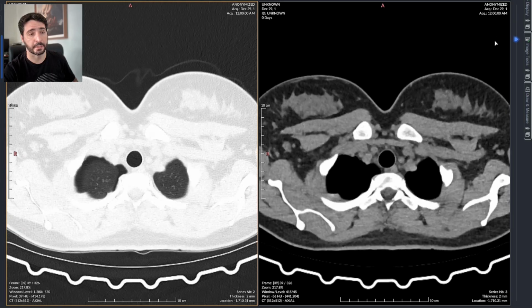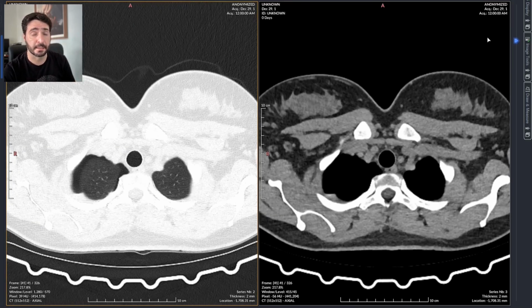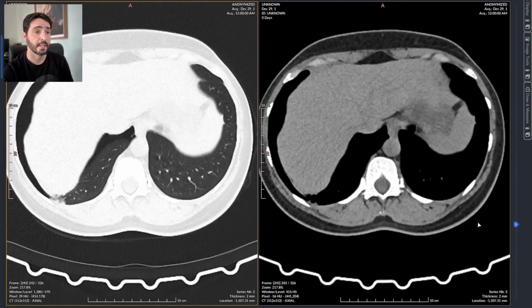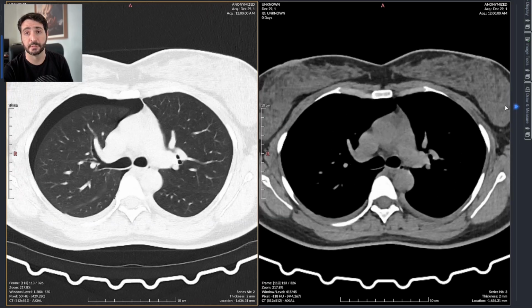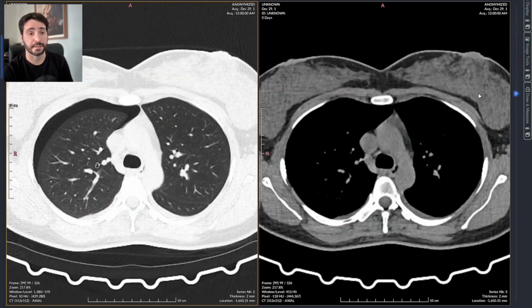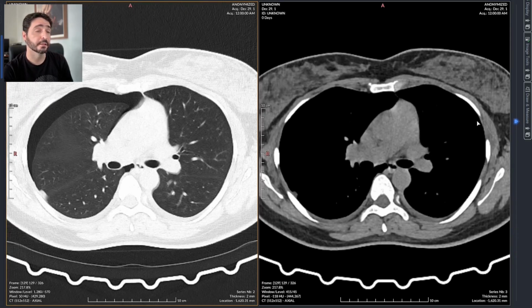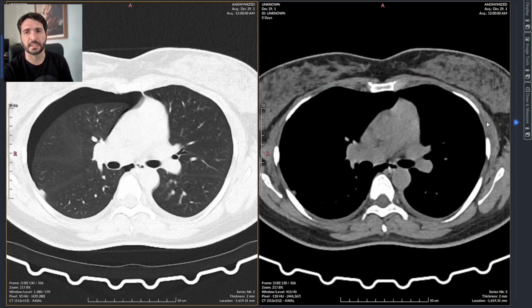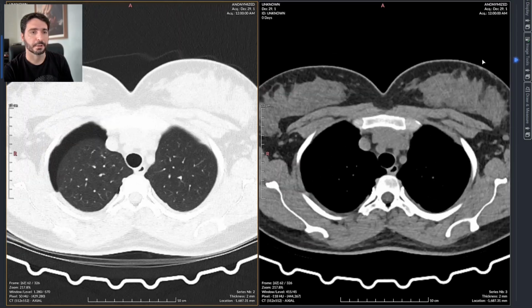I can't really tell where it came from, but I could guess it came from a small blob of air right at the apex of the superior lobe, which is the most common cause of such disease. So, as you know, we have also a bit of fluid, so this makes it a hydropneumothorax, not just a simple pneumothorax, which is quite common because there is pain, there is kind of a pleural inflammation in this case. So this is a surgical case. This should go to chest drainage in the surgical center, and the patient should be cured without major complications.